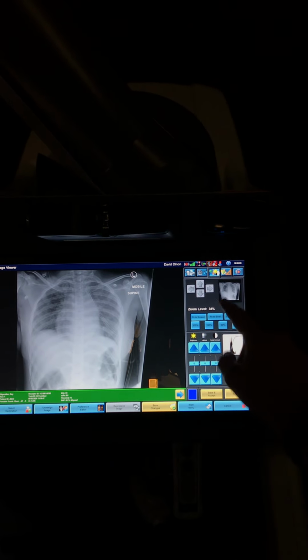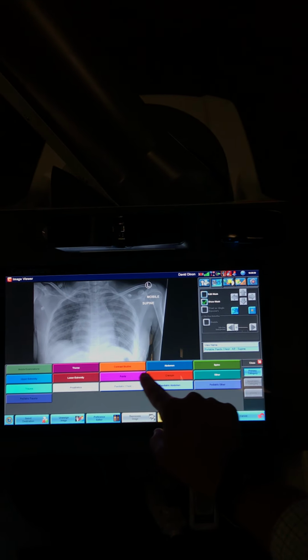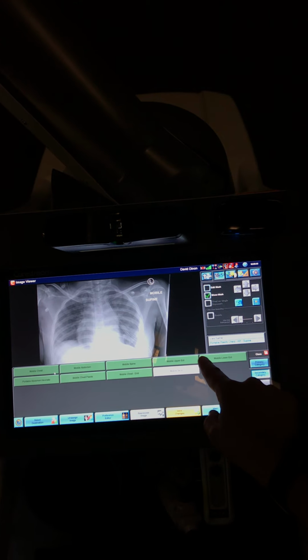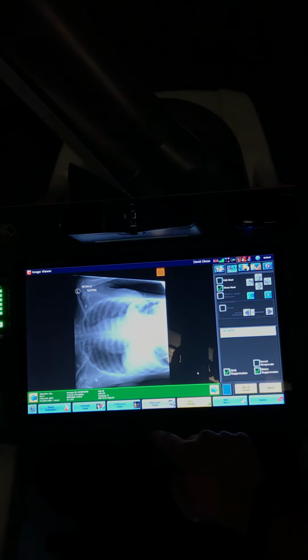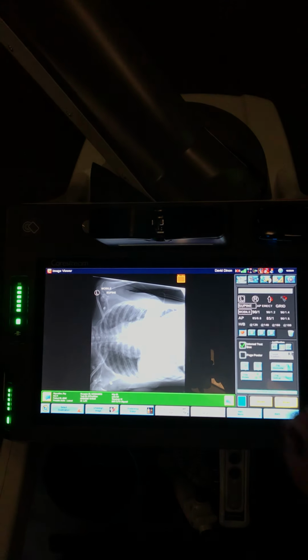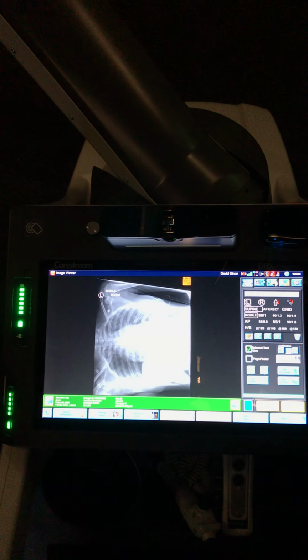Okay, so you can reprocess as anything you want. You're never locked out. I could process it as a hand, I could process it as a mobile hand or a mobile foot, lower extremity, ankle lateral. The data set now has been processed as a foot, with taking in mind that it thinks it's a foot anatomy in play.